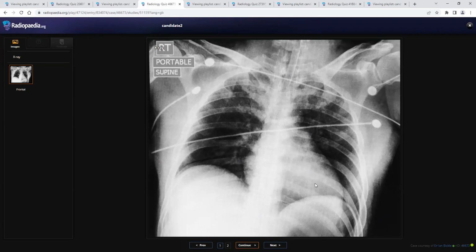One thing you should remember in the FRCR exam, you should never miss an emergency. That's what they look at in the candidates, whether he is able to do on-call duty on his own. That's the purpose of FRCR. FRCR candidates are ST3 candidates, year 3 radiology residents who will go into year 4 to manage the duties independently. That's the criteria. That's what they test in the FRCR exam also, whether you can manage an emergency, and you should not miss an emergency. That's the life-threatening one. So this is a supine pneumothorax, and you picked it out very well.